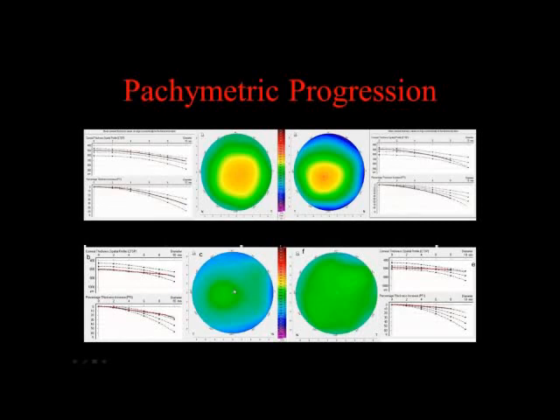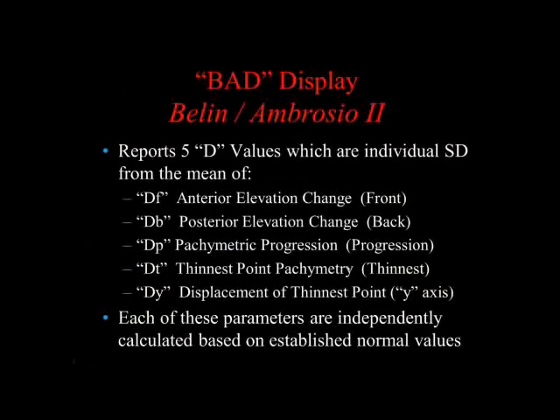These are two corneas we alluded to. Remember I told you before if the cornea was the same thickness, you would get a flat line? Notice the tracings here. They're fairly flat. That's because these corneas are edematous. When a cornea gets edematous, it increases in thickness in the center more than in the limbal region, and you lose the normal pachymetric progression. So if you see a flattening of the line right here, that's usually indicative of corneal edema or early endothelial decompensation.